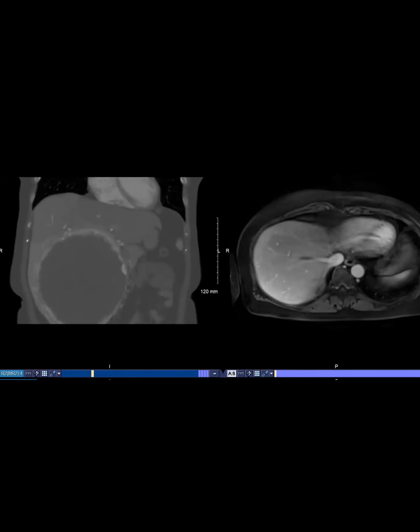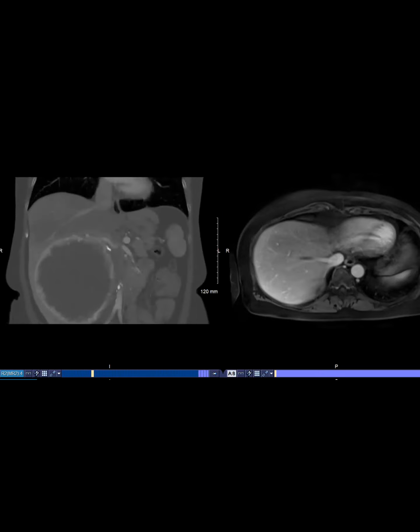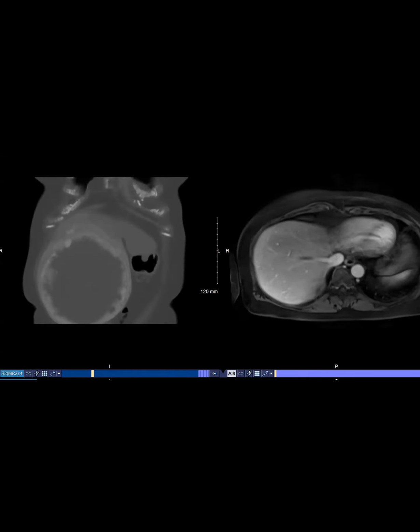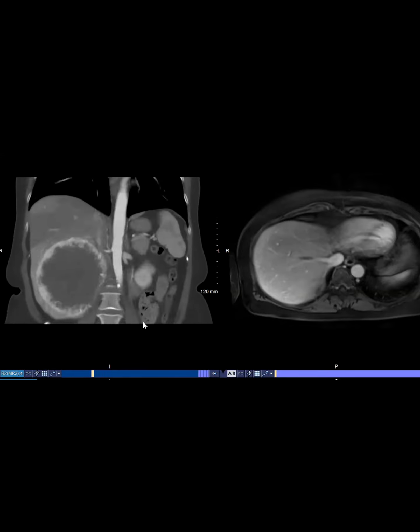Wow. Looks so aggressive, Victoria. Roopa and I were texting angiosarcoma. I've never seen one. Big vessels. Right, I mean, going. Yeah. Yeah, and that's right. No, like this looks like a neoplasm, right? Like whatever it is.